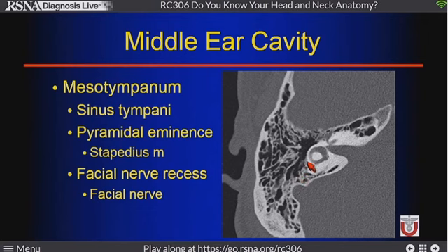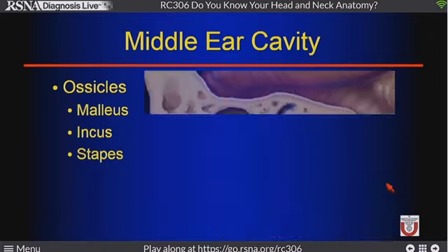These are important areas, again, with cholesteatoma. It's hard for the surgeons to go through the EAC and make this sharp turn to look at that very back wall, to look at that subtle anatomy. So this area back here is called the sinus tympani, between the pyramidal eminence and the windows. We think about that anatomy in that area.